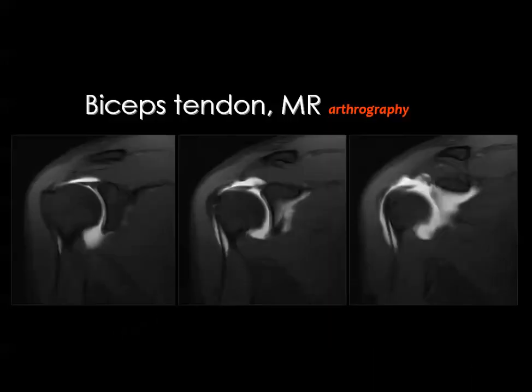If you want to see the full course of the tendon of the long head of the biceps, you may inject contrast media inside the joint to have an MR arthrogram. In this MR arthrogram, you can see part of the tendon of the long head of the biceps. Then another part will be seen in this image, and you can appreciate that the tendon is crossing over the head of the humerus to insert in the glenoid part of the scapula at the base of the superior labrum.